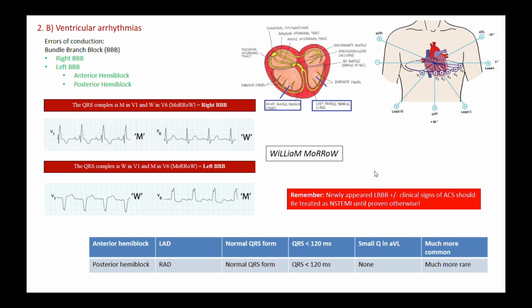Now, to see the difference between these two types of bundle branch blocks on ECG, because they have a common morphology in that usually their QRS complexes will be broad, because the conduction through the ventricles, through the Purkinje fibers, here, through the left and right bundle branches, is impaired. So the depolarization does not occur as rapidly and smoothly as normally, so we get more broadened QRS complexes.